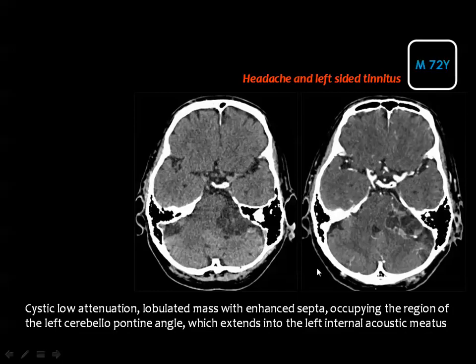Axial CT scan of the brain before and after contrast injection, showing a cystic lesion at the cerebellopontine angle. This lesion is extraaxial because the ipsilateral cistern is widened. Then you see marginal enhancement after injection of contrast. A diagnosis? Epidermoid cysts do not enhance. No.